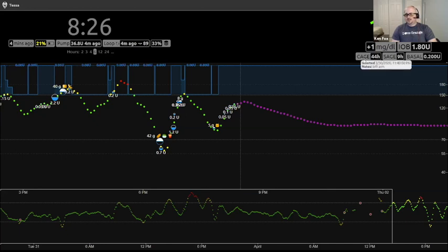Cage. We'll cover all the activities, but this is the cannula age. So C and then H, cannula age. You can use this to track pump site changes, or in the case of an Omnipod, changing the actual pod. And when we go over the activities in a moment, you can see that you can add notes, and you see the notes show up here. See how it says notes left arm. I made a note of where I put it and logged it. Now it says it's 44 hours old, which is pretty accurate.